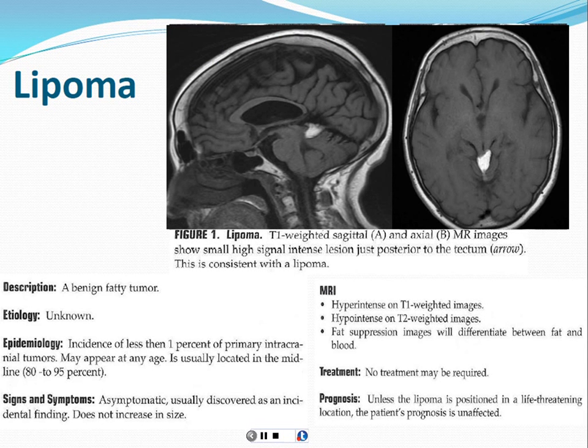The importance of using MRI in this case would be to just differentiate this from something that you need to worry about or do anything surgically about. So, these are T1 weighted images. This is usually how every MRI of the brain starts. As you know, you get this nice sagittal image. Look at all your midline structures, and this is a really typical location. It's bright, like the subcutaneous fat. It's really characteristic, and this is just an axial image showing the same thing.